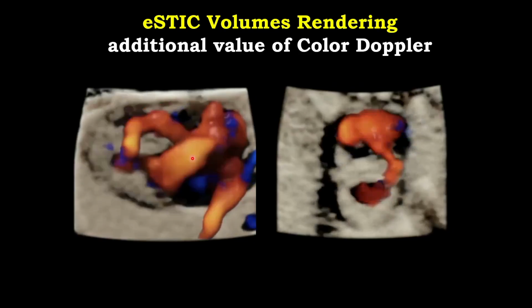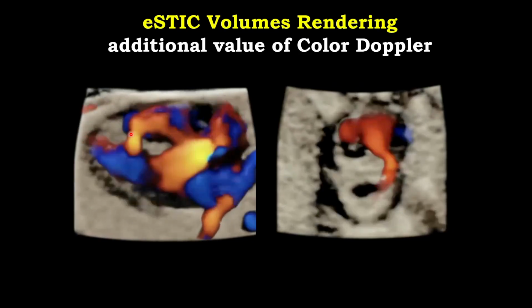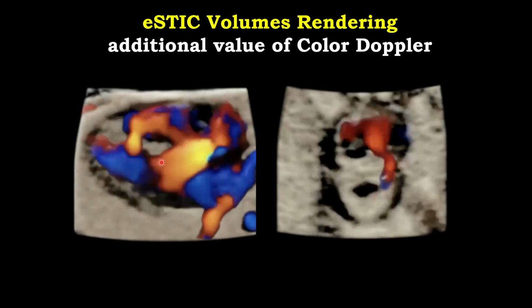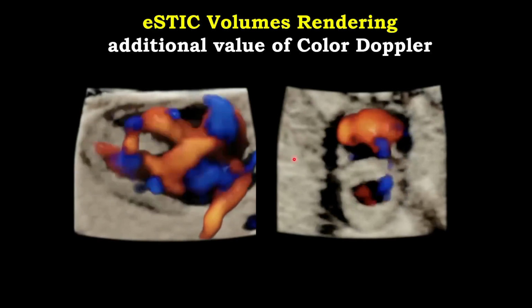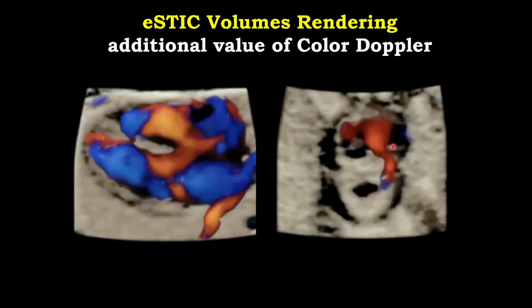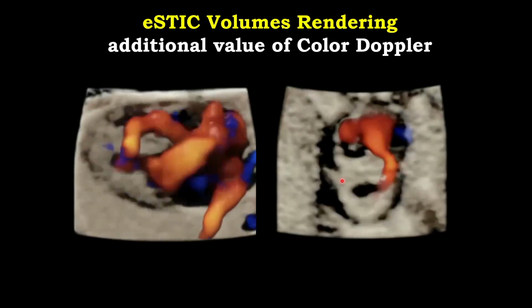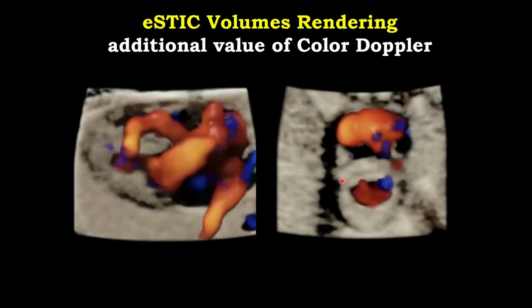It's an outlet VSD because it's located in the anterior portion of the interventricular septum, and you will be able to see it only when you're leaning towards the left ventricle outflow tract, and this is because it's located high here, as we can see in the cross-section view of the ventricles. Both of those views we can obtain from one volume, and this is very helpful for the precision of our diagnosis.